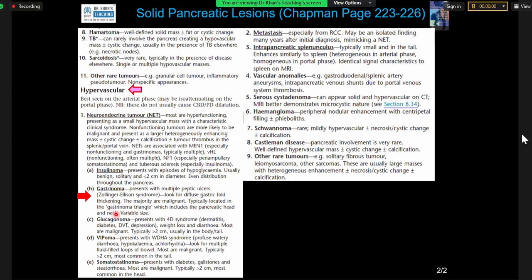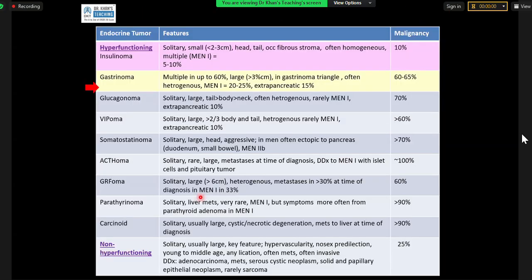So your eyes should be trained for this. You picked up the finding beautifully, so well done for that. But you could not make the connection between the two, which include the head. And I'll show you a diagram to show this.